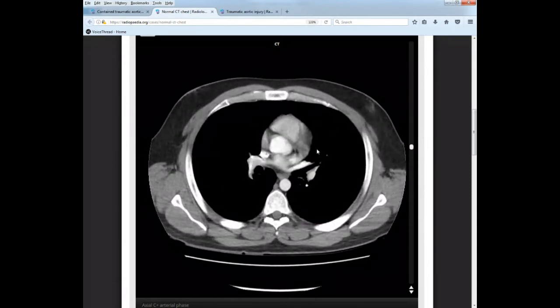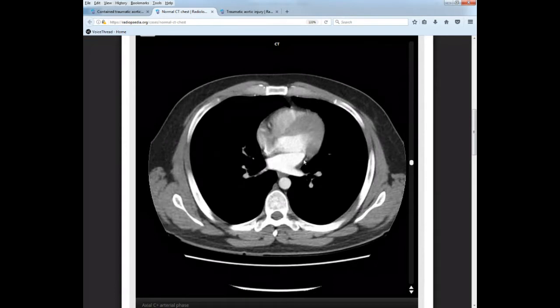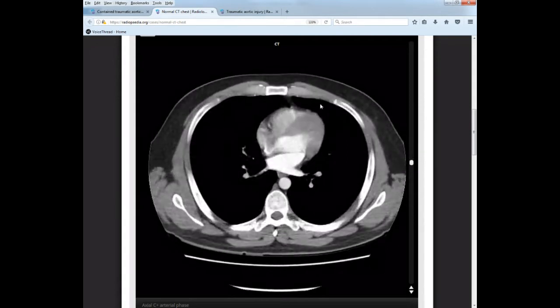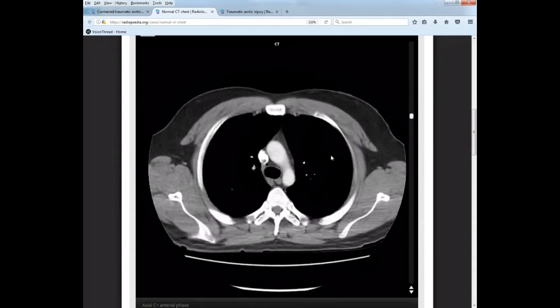All right, and as I travel inferiorly, I'm going to see a notch notched out in the left lung that allows for the heart to sit right in there. There's your cardiac notch. And then remember that little tongue piece anteriorly that looks like a tongue? The lingula of the left lung sits just anterior to the inferior portion of the heart, right there. Okay, so hilum, lingula, cardiac notch on both a coronal and an axial view. You should be able to see. Okay. Hilum of the right and left lung as well.